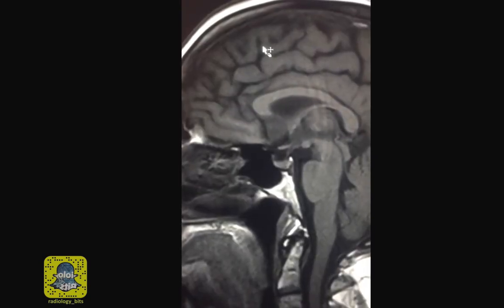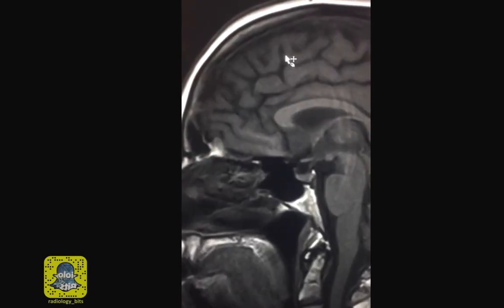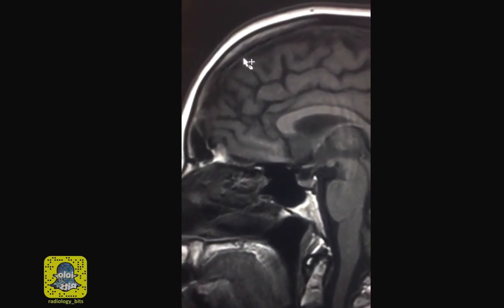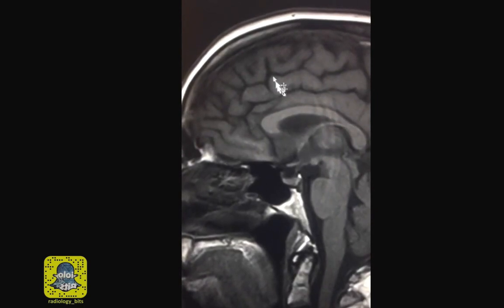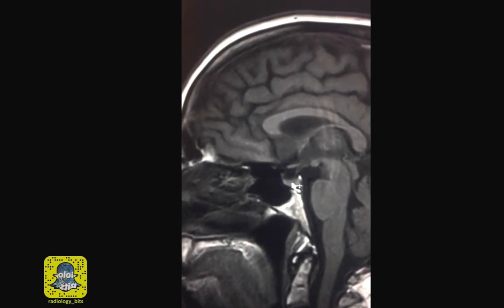But for now, let's summarize the few points that we could take away for both seniors and juniors. First, when you're looking at a brain MRI, don't forget to look outside of the brain, namely the bone marrow. Areas to look at would be the calvarium, the skull base, and the upper spine, and don't forget the clivus is a good bone to use.